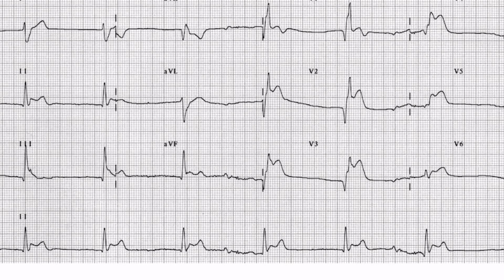So essentially what you do is find the peaks of the R waves, and count how many big boxes are between them. So this is right before the line, so we'll go 1, 2, 3, 4, 5, 6, 6.5, let's say.